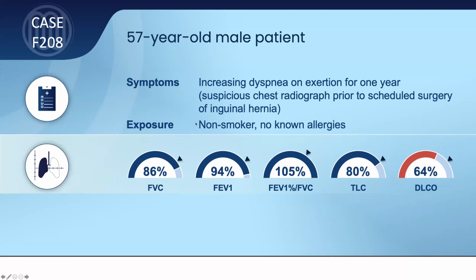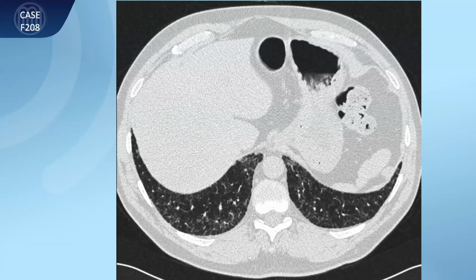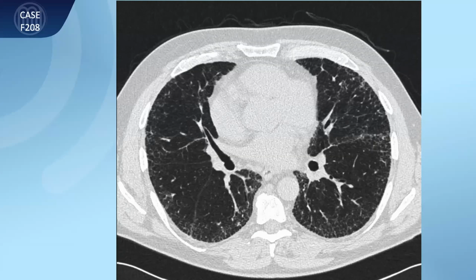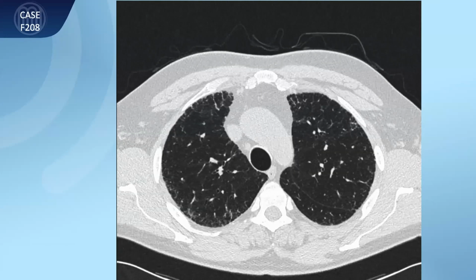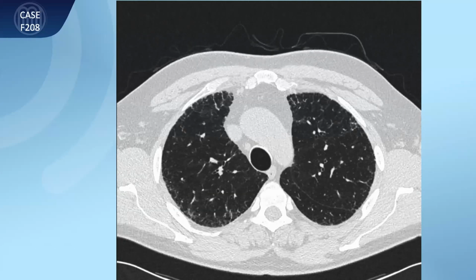So this is a patient, again, with signs of a connective tissue disease. And I don't want to go into detail here. We have to stop finishing time, I was told. But looking at the CT scan, let's go and poll again, because this is important here. I walk through the pictures, and then I'd like to ask you to answer poll set number 2 again, please. Could you please start that?